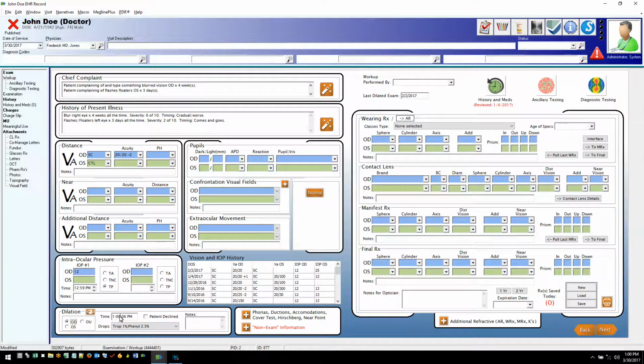But again, 99% of your patients are always going to be the same. So we tried to build those efficiency tools in there for you to save some time. You'll see normal buttons like this, same type of thing. 9 times out of 10, it's going to be the same for everybody. You click the normal button. If you have the one patient that comes in that has something wrong, you can still click the normal button and then just go back and change the one thing or the two things that you found, and it still will help you speed things up inside of your exam.